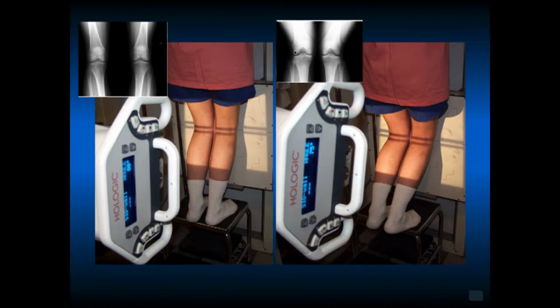So these sometimes are used as the notch views, where people can look at the notch for osteophytes or measure the notch as it relates to the notch width here and do a ratio of the distal femoral width. So some people use this as a notch view as well. So this is more for osteoarthritis. You can use this as a notch view, but be consistent and make sure that the radiology techs are getting it in the degree of flexion that you want it in. So at 45 degrees flexion, you can see the joint spaces as well as the notch, and at 15 degrees of flexion, we don't see the notch as well.